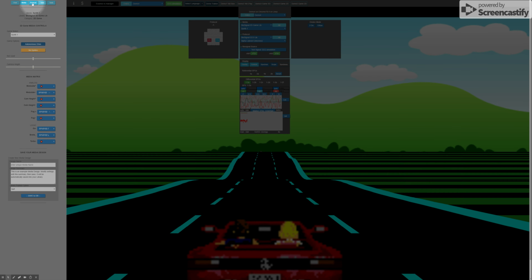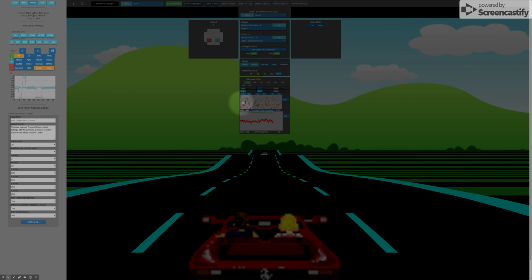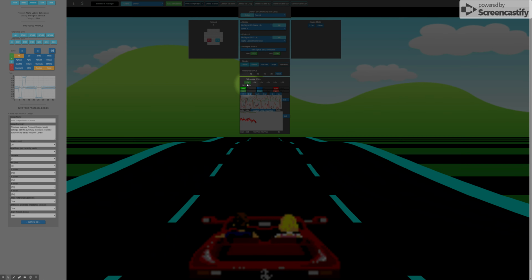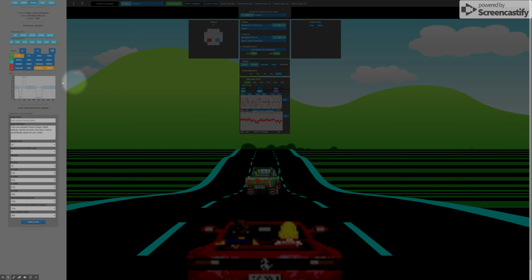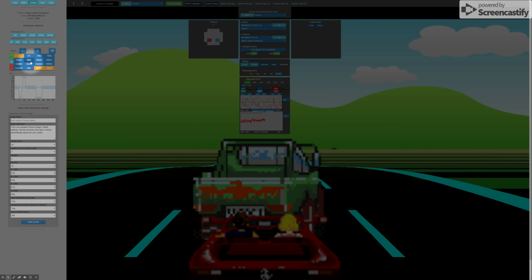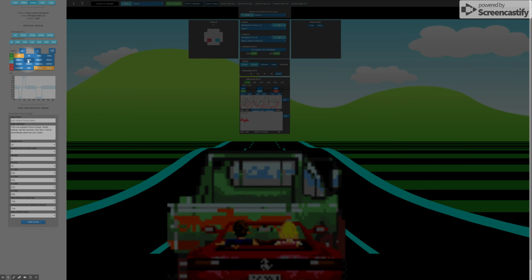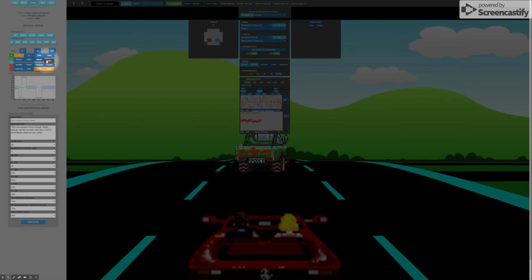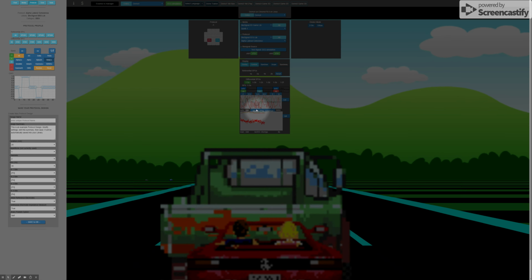Okay, similarly under protocol, if we look over here, we can see under this particular signal processing unit, which is SPU12A, that particular configuration. If that needs to be adjusted in real time, it's done here. For example, if we wish to, we'll select the maximum value there, then we'll click on alpha and alpha high and beta high, and you'll see that that's also changing over here.